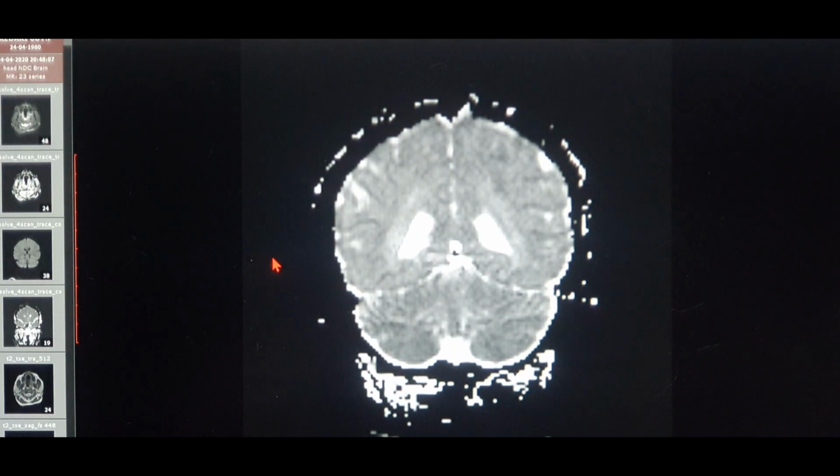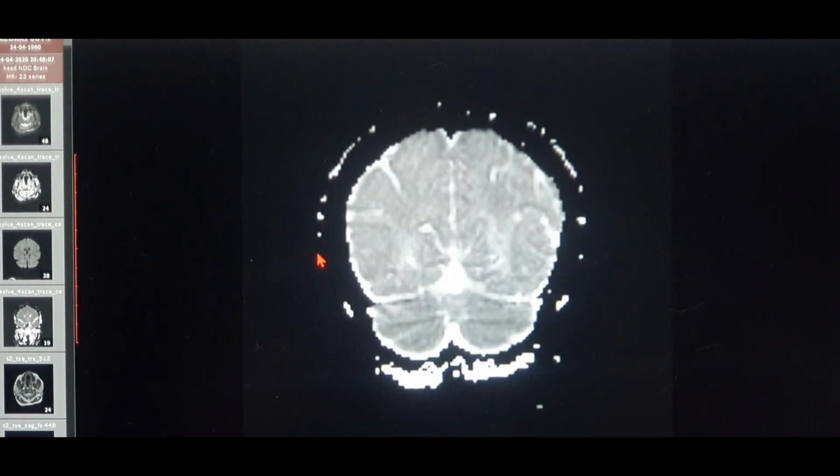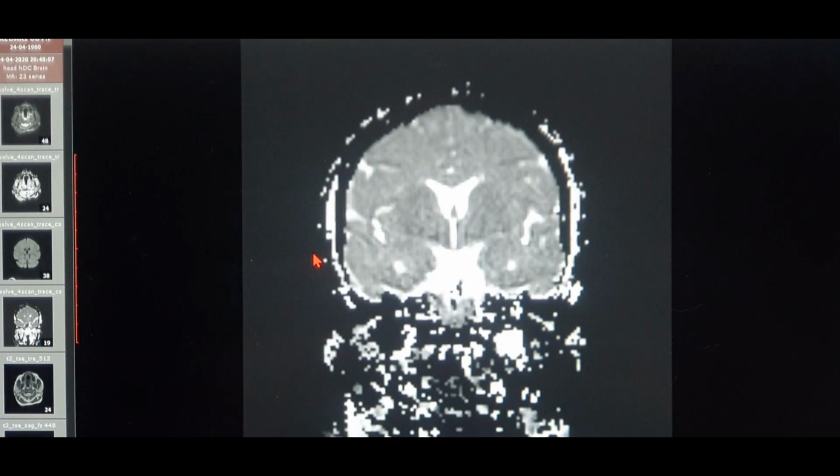So you can have a discussion with your radiologist about the importance and significance of the ADC in diffusion of water molecules in cases of malignancies. Basically, most important for the ENT surgeons is the malignancy, mostly in cases of sinonasal carcinomas and the conversion of the inverted papilloma. So in those cases, the diffusion weighted image, the ADC images are really important. So I hope now all the different variants of the MRI, that's the T1, T2, post contrast T1, then the FLAIR image, the diffusion weighted image, the ADC image are all clear for you guys.